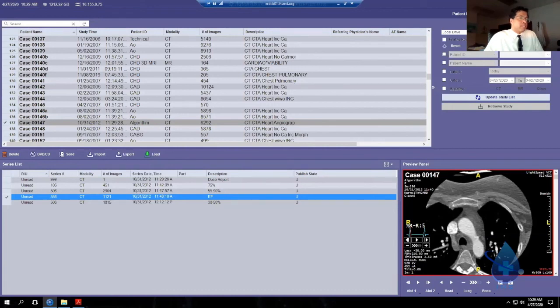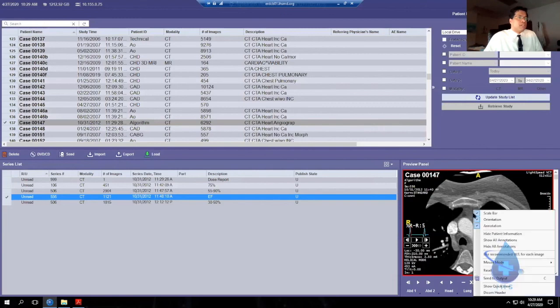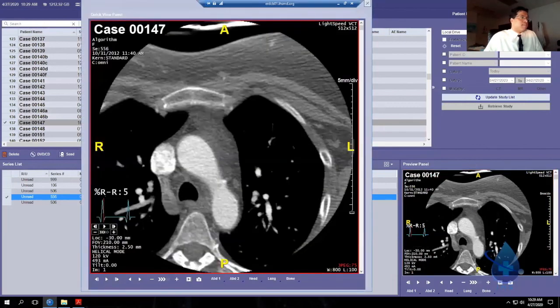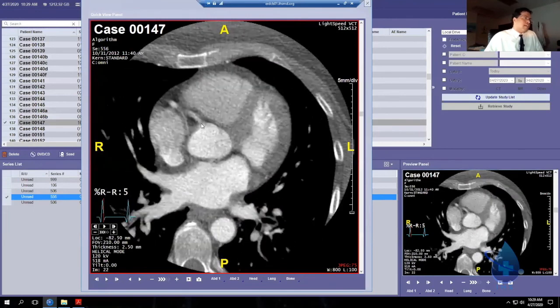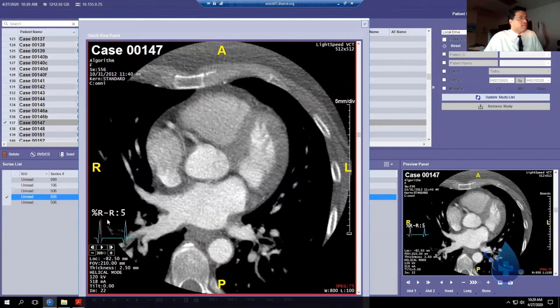And typically that's ejection fraction calculation, but you could also use it for something that doesn't need that thin a slice. You can use it for finding a wall motion abnormality. You can use it for doing a mechanical valve cine like we're going to do this week, anything that's larger than a coronary, any structure that's larger than a coronary.